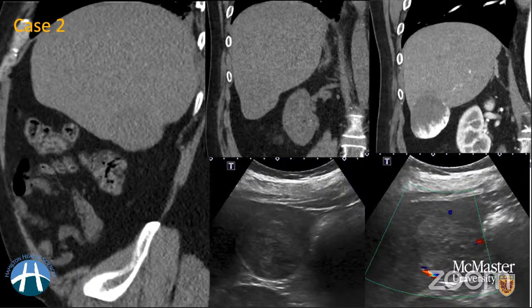It grew on the follow-up ultrasound and it was a colorectal carcinoma metastases. So something which is really important to remember when you're dealing with echogenic liver lesions. But always remember, hemangioma is probably going to be the most common of those entities, but always remember to give your differentials.